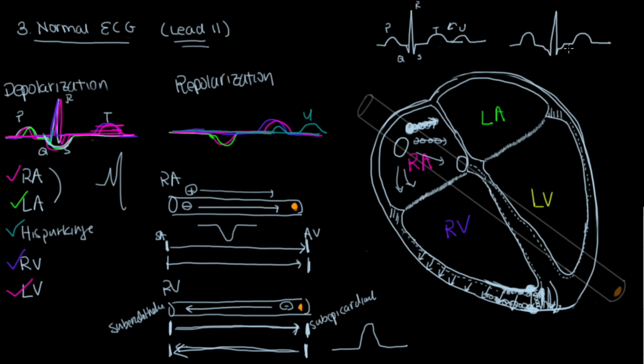Now, this scooped portion here, it almost looks like a little scoop up there. That would correspond to the repolarization of the atria.